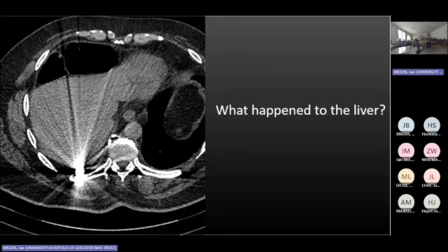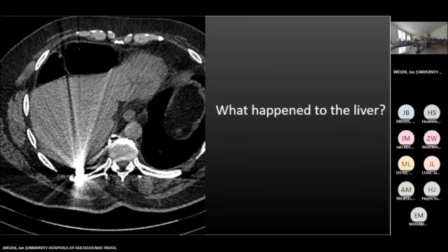I was thinking it looks too organized, like the lines that come out look too organized to be something like an interference or an artifact. It's called beam hardening artifact or streak artifact. So yeah, I agree. There's something that is very dense, and it's even denser than the spine. Yeah, so it must be metal. But is it in the right place? Probably not.